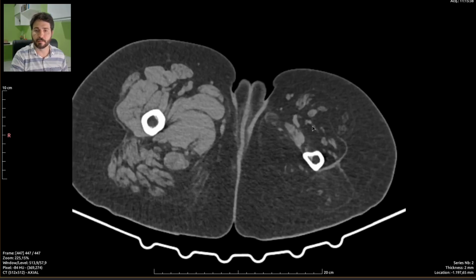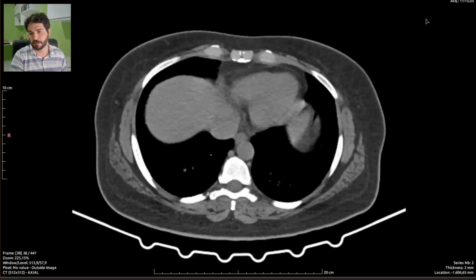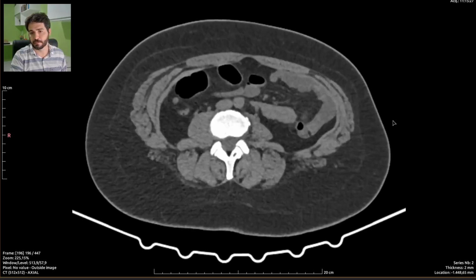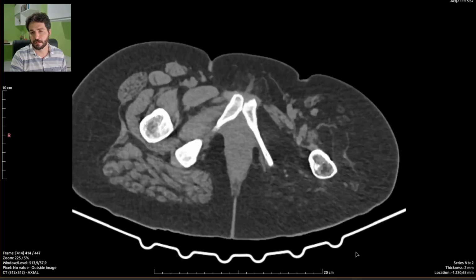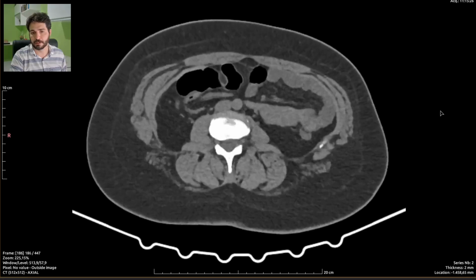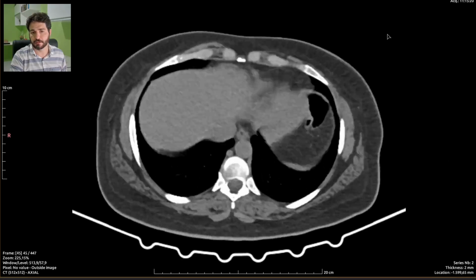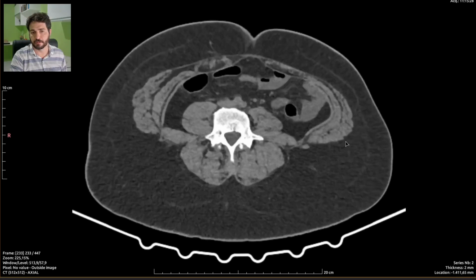This is most probably the left leg of this patient isn't functional. It's probably paralyzed. This leg is probably paralyzed. She probably uses crutches to walk around.